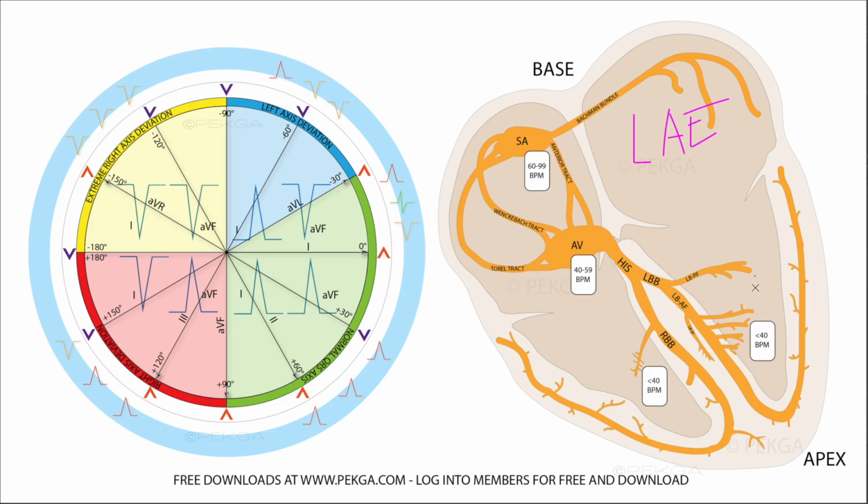And then there's an issue with the left bundle down here, some sort of an incomplete block. There's a structure in between those two phenomena, if you will, and that's your mitral valve. Your mitral valve is the valve that connects the left atrium to the left ventricle. There could be an issue with this mitral valve. Everything we're seeing on the ECG could be indicative of some sort of an issue with the mitral valve. And why do I mention that?